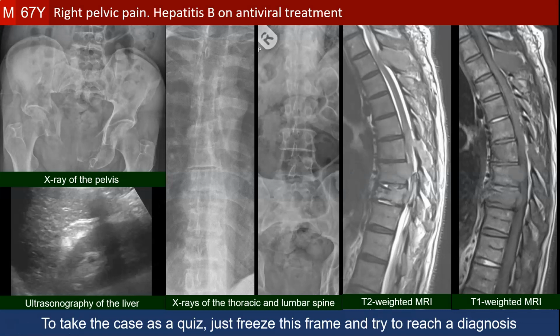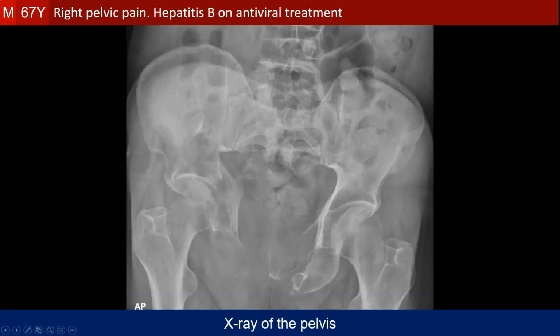This is a 67-year-old male with hepatitis B on follow-up by ultrasonography for hepatocellular carcinoma who experienced right pelvic pain. This is the X-ray of the pelvis, and it shows extensive osteolytic lesions of the pubic rami. It shows also a fracture line in the right iliac bone, which is probably the reason for his right pelvic pain. And we notice here that fractures of the iliac blade may appear as lucent lines, but also as bright lines because of the overlap of the fracture edges.